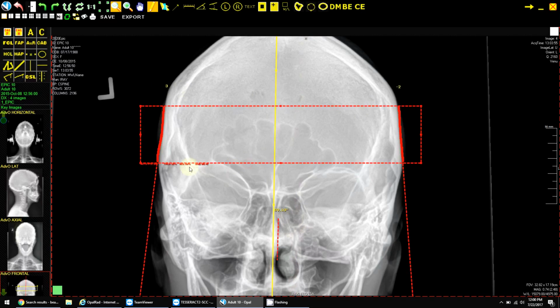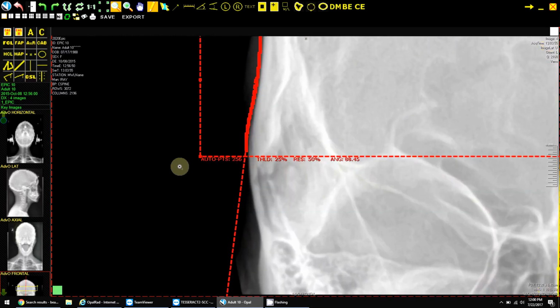You can click on here and zoom in and see what some of the angles are. This is actually showing that the average of the two angles, or the summation of the two angles, is 88.45, and they're using 256 points. Unfortunately, you can't alter any of this. This is just all automatic.